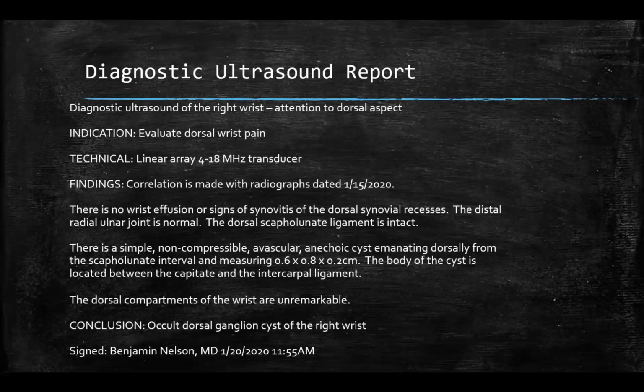And I don't know if you have more information specifically about giant cell tumors and how those look. Yeah, giant cell tumors can be hypoechoic. Small ones you may or may not see Doppler activity. This would be a very unusual location for a tenosynovial giant cell tumor, but never impossible.